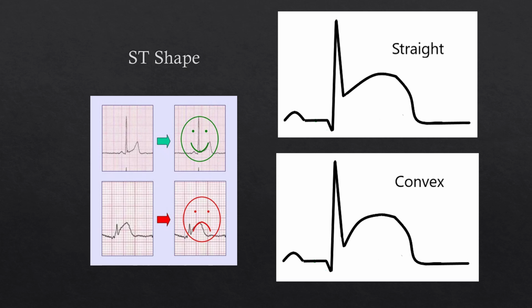Another interesting tidbit for the ST shape is that it will often change before the ST segment elevates, making it an early sign. This can catch your attention. And again, if you're that pre-hospital provider or rural ED provider and you're worried about this patient, you see that, while it may not be enough as a standalone to activate STEMI, it may be enough to make you recognize this is a dangerous patient. I need to watch them closely. I need to get them to the right place. And then you start doing your repeat ECGs.